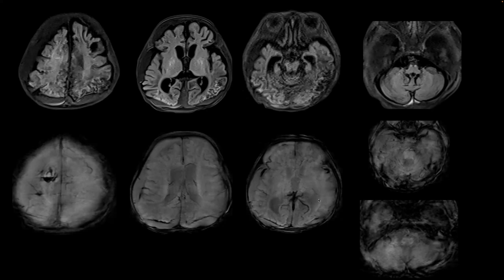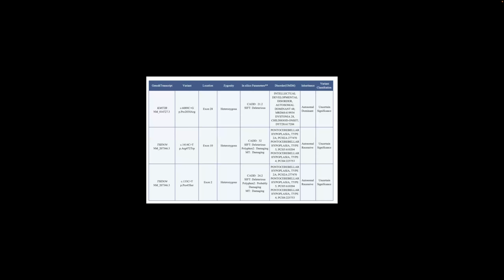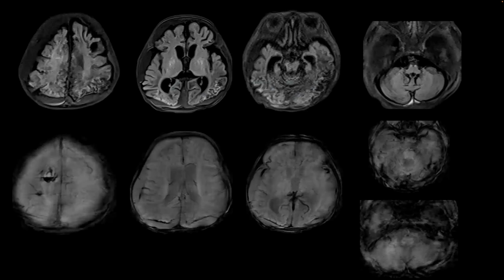These are the SWI findings, and spectroscopy was done, which demonstrated elevated choline, and the rest of the peaks are reduced. So at this point, the possibilities raised were, given the 3 cardiac arrests and possibility of global hypoxic ischemic injury with the adenovirus infection, whether these changes are contributory to the follow-up scan, given that there is significant atrophy resulting in bilateral subdural hematomas.